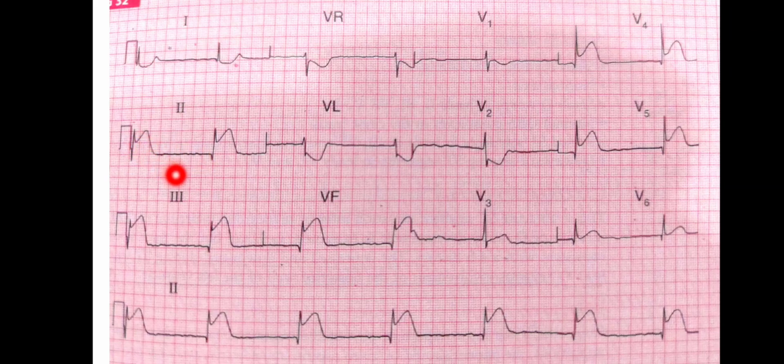So the rhythm is not irregular. Most of the time, when you are unable to find the other things, you have to comment that this is a sinus rhythm most probably, because otherwise it does not fit into any other rhythm in the present situation. It's not a rule, but a general concept that I want you to know.